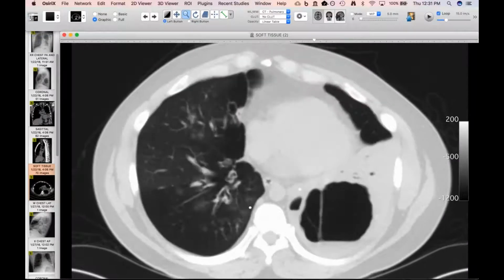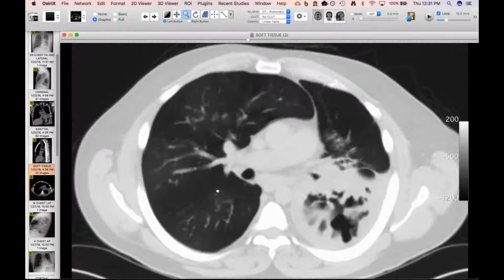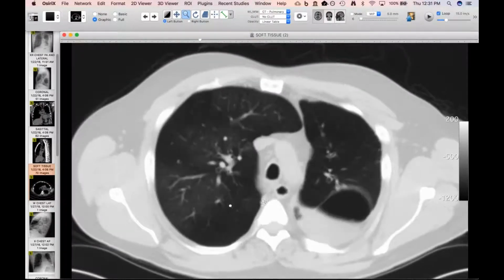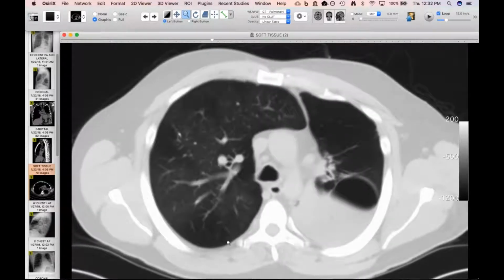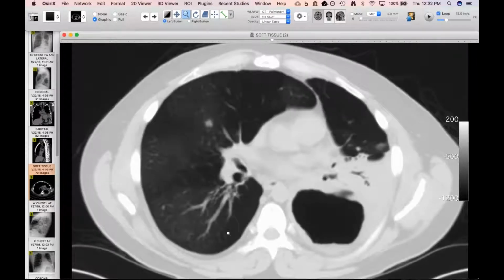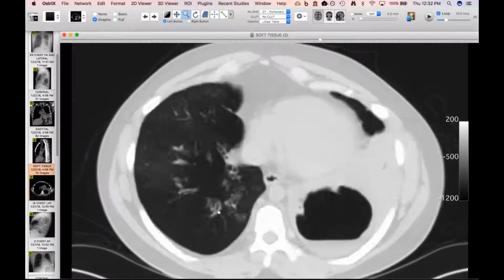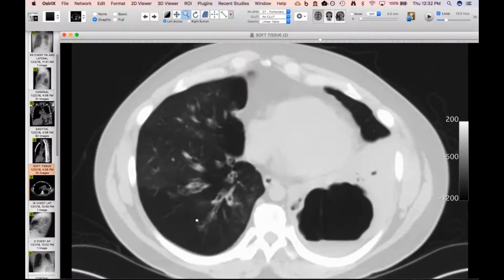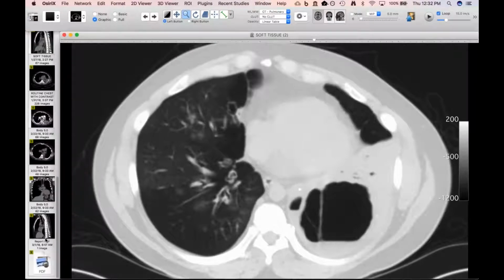But if you look at the rest of his lungs, you see that he has very abnormal substrate really everywhere. These are, unfortunately, the thinnest images we have. But he has a lot of bronchial wall thickening, a lot of mosaic attenuation throughout, and these areas where you have lucent lung, really smaller vessels in those areas, and it affects both lungs. A lot of bronchial wall thickening, but just notice here, it really looks like an obliterative or constrictive bronchiolitis in some of these areas. So I've got a lot of studies here.